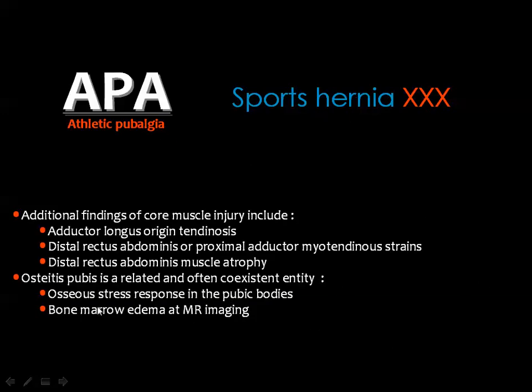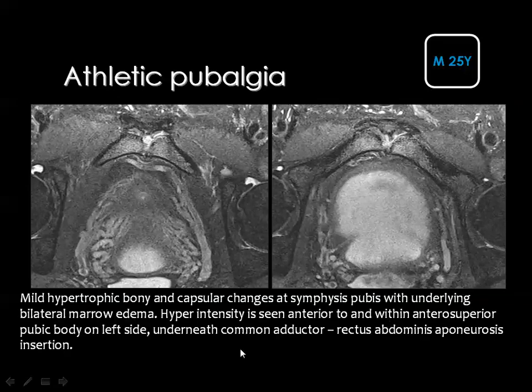You got osseous stress, and this will present by bone marrow edema on MR images. And here you can see the irregularity of the pubic bones. You can see the bone marrow edema, and also you can see fluid underneath the core muscle insertion.